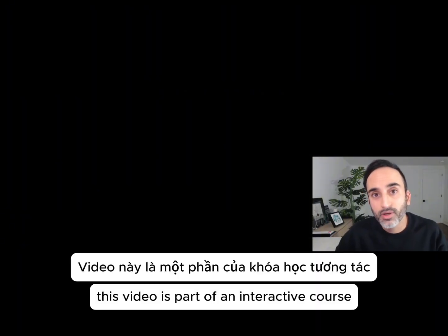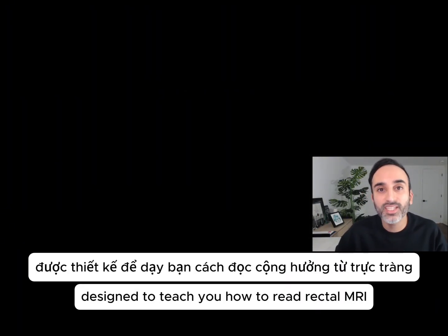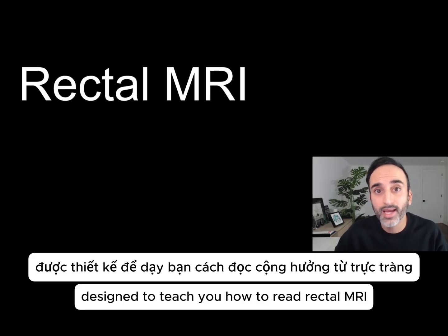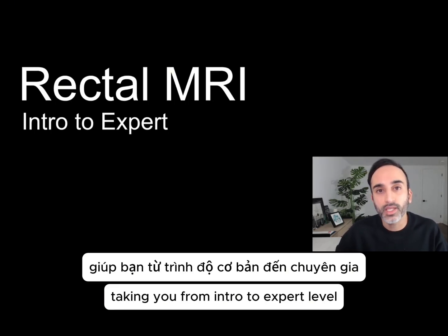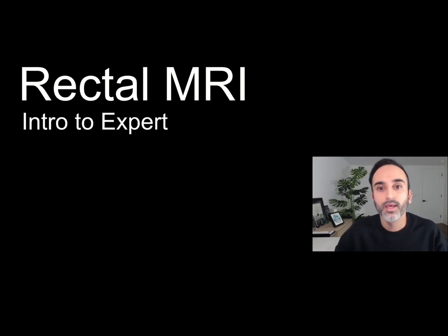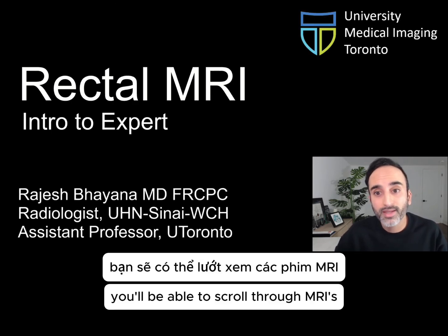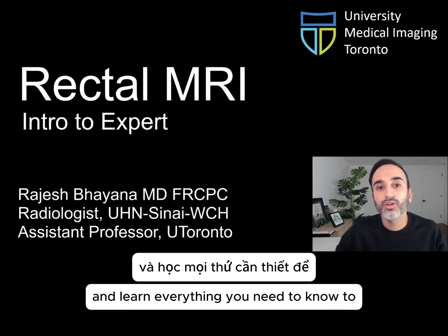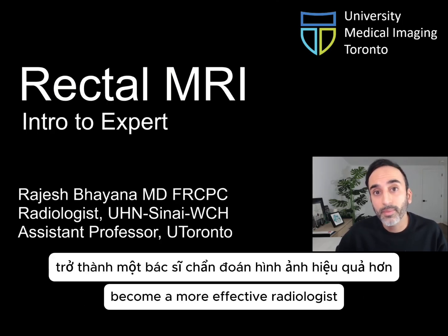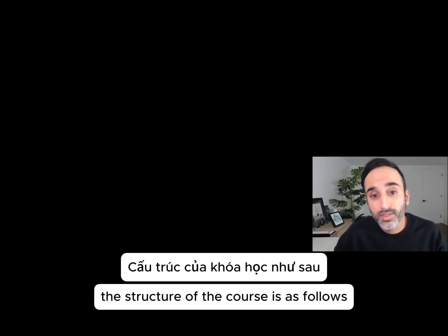This video is part of an interactive course designed to teach you how to read rectal MRI with a focus on staging rectal cancers, taking you from intro to expert level. You'll be able to scroll through MRIs representative of the most important pathologies and stages and learn everything you need to know to become a more effective radiologist. The structure of the course is as follows.